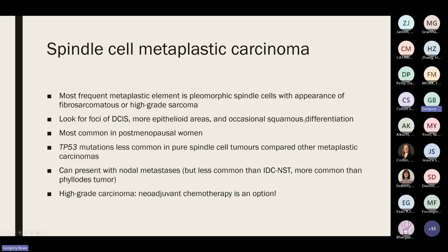You can see occasional squamous differentiation, both in metaplastic carcinoma, but also you can see focal squamous differentiation in other breast malignancies also. That doesn't necessarily mean that we give different names to them and don't call it metaplastic carcinoma if we see focal squamous differentiation in some of them.